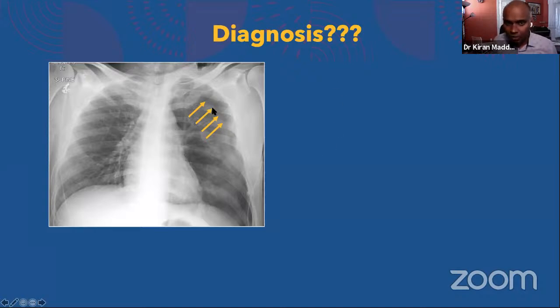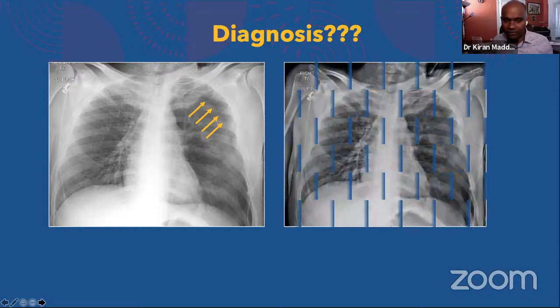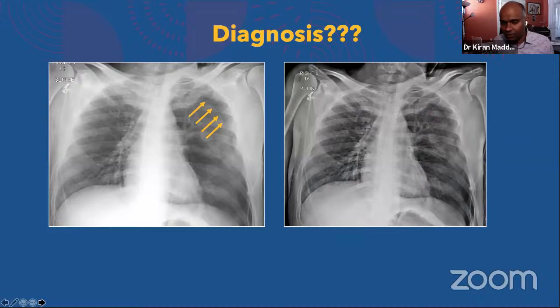So this is a pneumothorax. You can see the pleura is having a reasonable or a decent pocket of gas here. Descriptively, I say a moderate pneumothorax, definitely not a tension pneumothorax. And this is an inverted image of the same patient, where sometimes I find the lucency of the visceral pleura. This is the visceral pleura, the air accumulating between the parietal and the visceral pleura, and the visceral pleura can be better identified in an inverted image. So this is a pneumothorax.